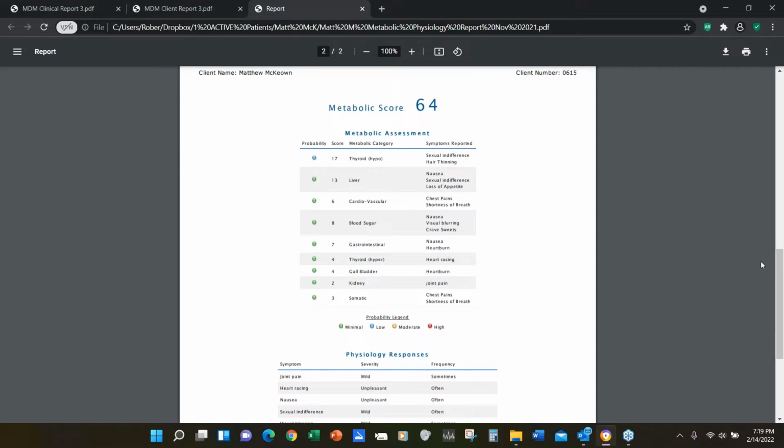I'm not sure how old the person is, but I say generally, I'm okay with a score between 40 and 50. Now, usually I'm looking at a score that's 125. I'm hardly ever looking at scores that are 64. So what that says to me is there's some imbalance going on in your body, your gut, brain, and we're going to explore that further. So right away, I'm setting up the conversation for a bigger conversation than what we're going to do neurofeedback-wise.